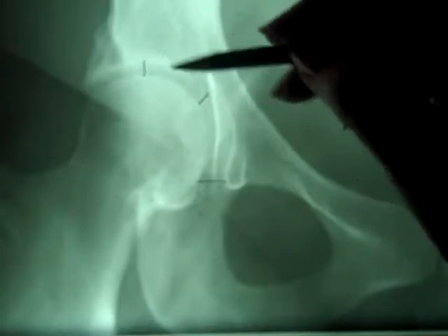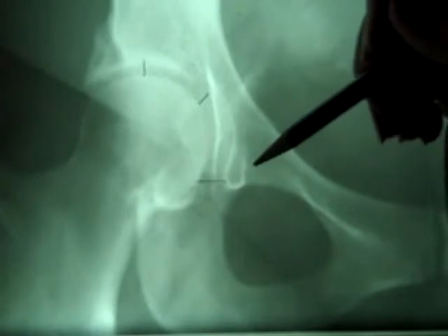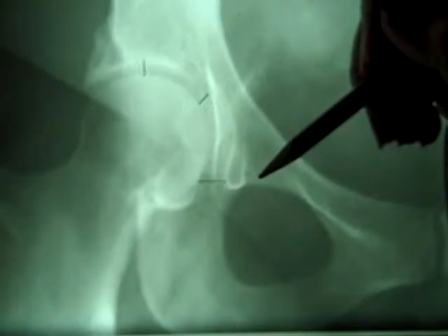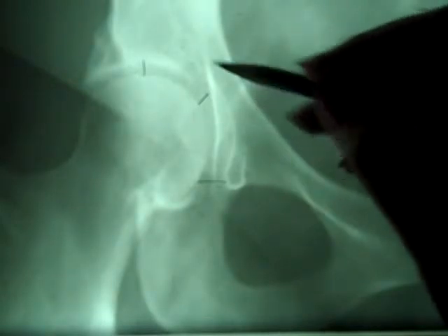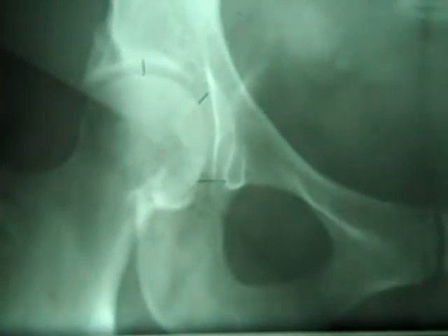If you see these numbers are smaller than they should be, you're probably looking at something such as a pathology that causes a decreased joint space. And that would be any of your arthritis. That would be anything that is causing a loss of joint space. And so those are the things that you want to think about for hip joint width.